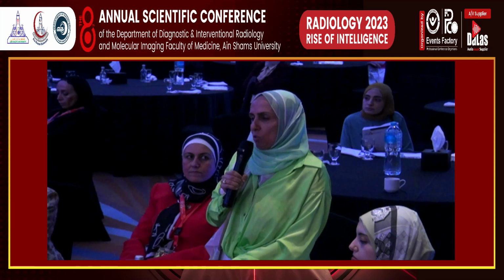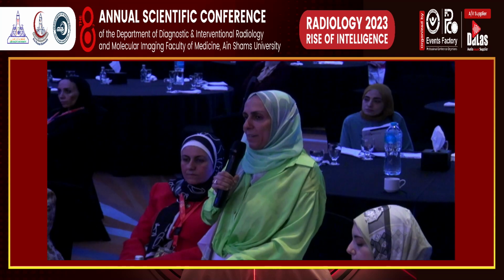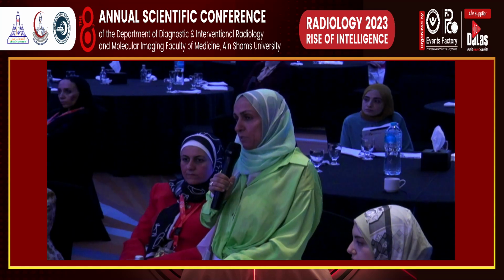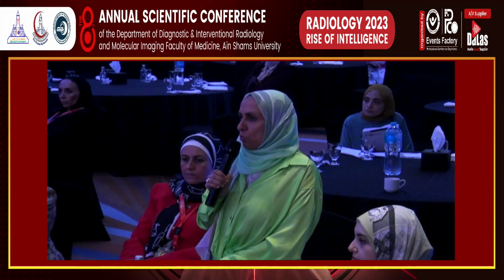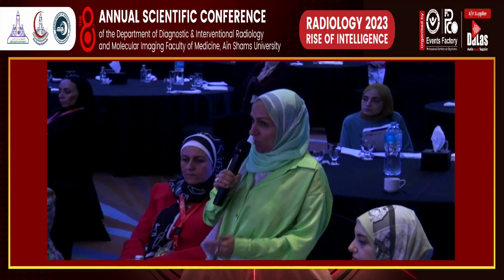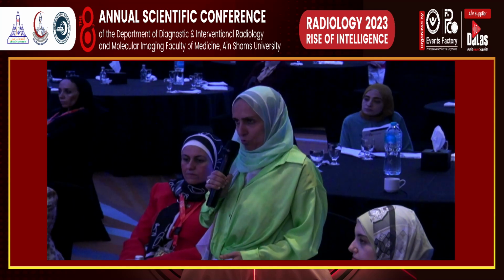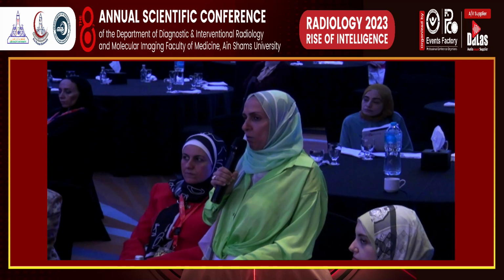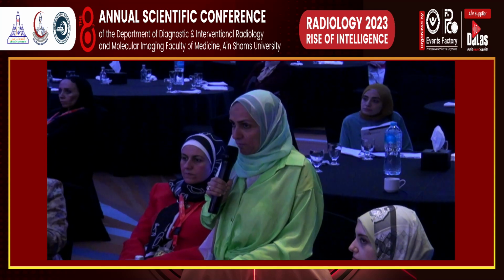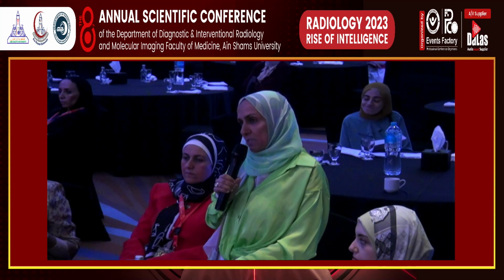هي الفكرة إن الريكومنديشن لسه ما اتغيرتش من المالتي بارامتريك للباي بارامتريك بسبب الكواليتي بتاع الديفيوجن ويتد إيمجز. يعني هو لحد دلوقتي it is recommended to use المالتي بارامتريك كباك أب سيكونس علشان الديفيوجن ممكن across the different centers ممكن ما تبقاش homogeneous، يعني ما تبقاش في good quality diffusion weighted images. بس لو we reached good quality diffusion weighted images ساعتها recommendation may be changed إلى الباي بارامتريك، لكن هو ده لسه لحد دلوقتي ما حصلش، بس more research is needed.